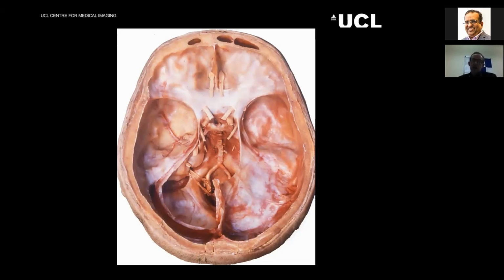So in terms of gamesmanship and what you should be thinking of when you're presented with a case: if you're looking at something that seems to be arising from the posterior cranial fossa, then it's going to fit into a pattern of, is it a child or is it an adult? And actually that's the approach for all of your brain tumours. But also, what could they be asking me in the posterior cranial fossa? Well, really, they're going to be looking at things like cerebellopontine angle lesions. And then you think, right, okay, there's only really going to be three main ones. How do I differentiate between these?